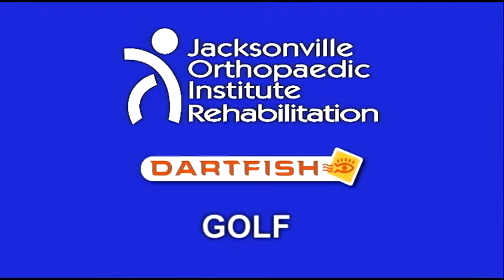The purpose of this video is to introduce one of the many services we offer in our rehab offices. Dartfish is the leader in video analysis technology. It is the industry standard used by universities, academies, professional organizations, coaches, and athletes worldwide.